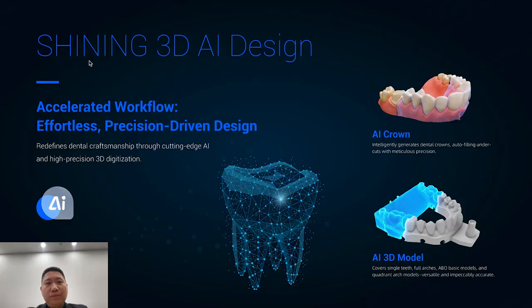Since we have scanners like oral scanner, facial scanner, desktop scanners, and we also have 3D printers, why not extend the AI applications to the design phase to streamline the whole workflow.